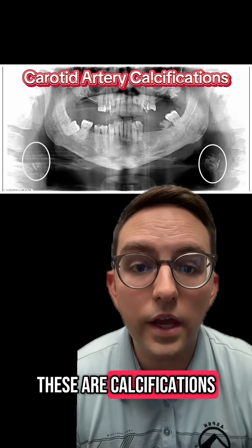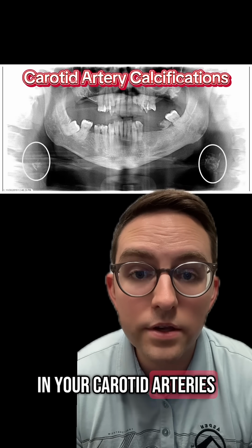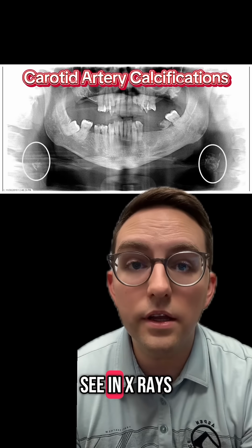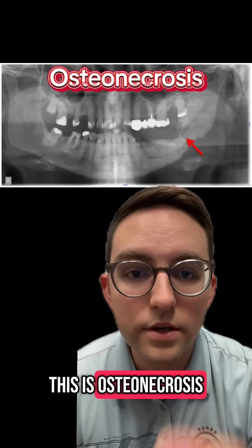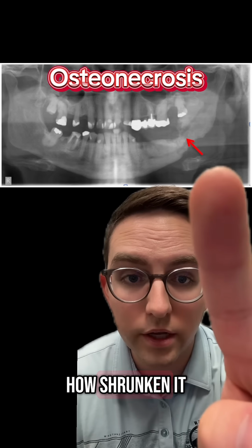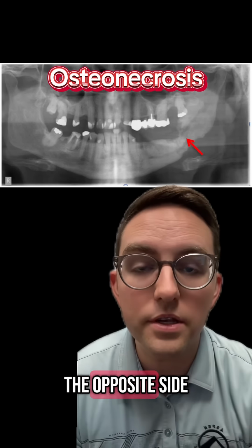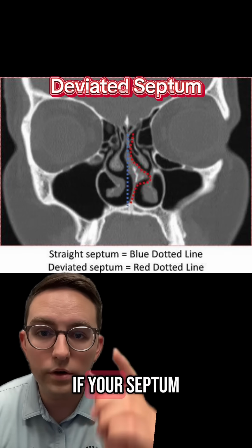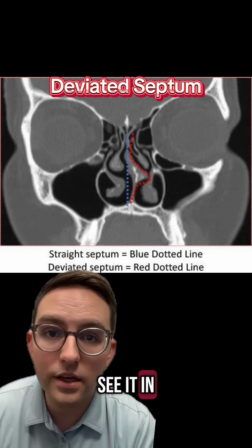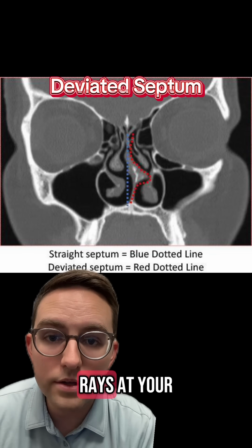These are calcifications in your carotid arteries. This is obviously an older patient, but these are kind of things that we can see in x-rays. This is osteonecrosis. The bone there is dying or resorbing. You can see how shrunken it is at the red arrow versus the opposite side. Have you ever wondered if your septum in your nose is deviated or not? Your ortho can see it in your orthodontic x-rays at your ortho visit.